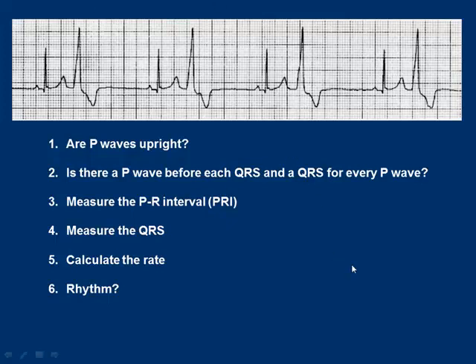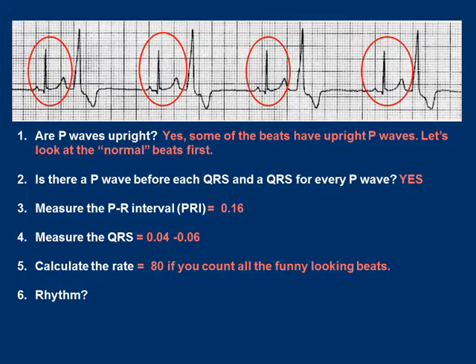This is a little bit more interesting, and we've got the 6 questions that we can answer to this. This is where a lot of students go, I have no idea. So let's look at it and do your recipe and take each piece at a time.